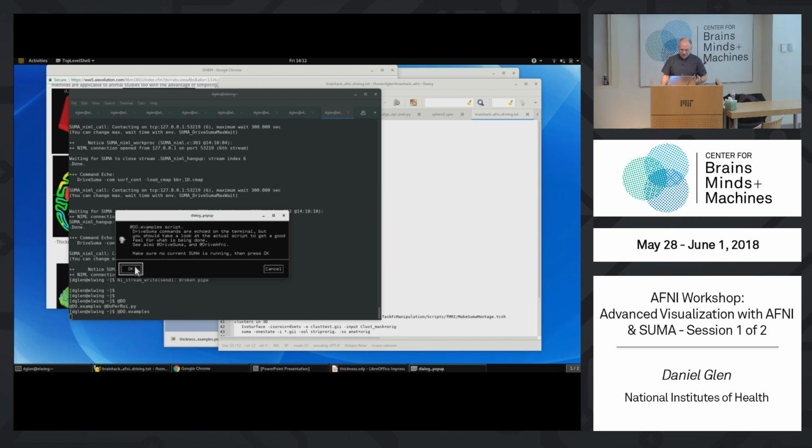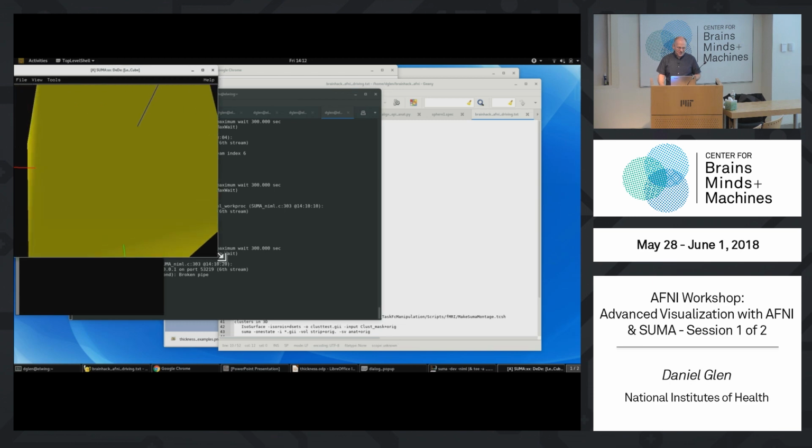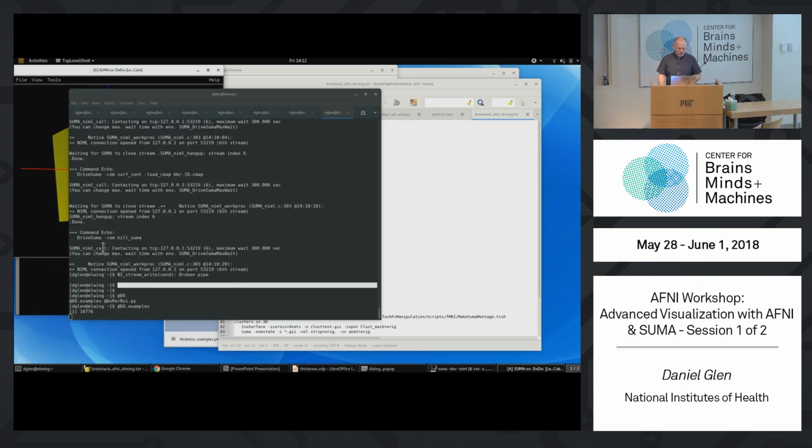Okay, it's another drive SUMA thing. You can edit it. I don't know, actually, I didn't try it last night. I was going to try it, and then I got distracted by the other one. Well, we'll see. I may have to fix this one too.